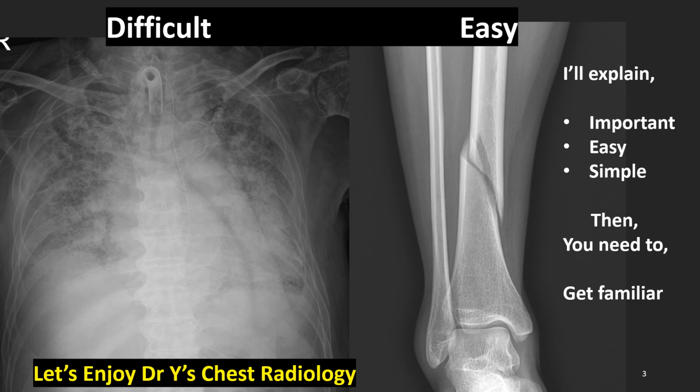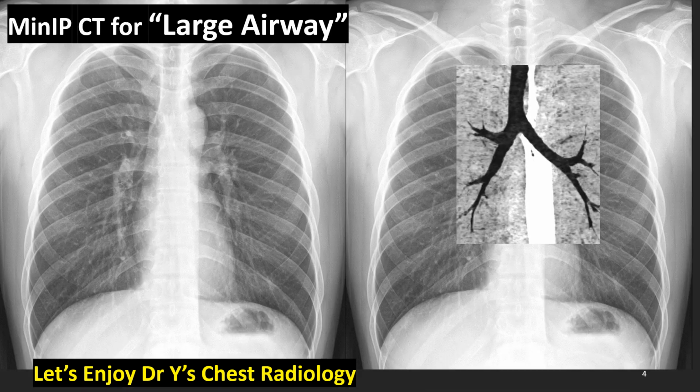So, with the chest radiograph, I'll explain important things first, easily and simply, and then you and I need to get familiar with the normal chest radiograph. Let's first start with a large airway.